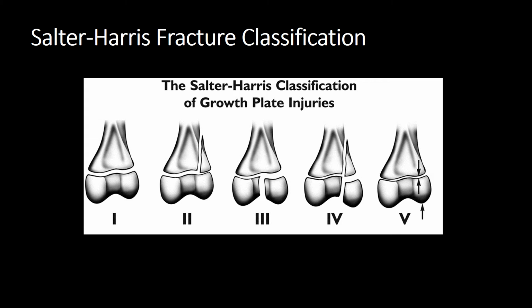So in long bones or miniature long bones, the tubular portion of the long bone or miniature long bone is referred to as the diaphysis. Once it starts to flare out, this area here is referred to as the metaphysis. The physis separates the metaphysis from the epiphysis, and the epiphysis is sited at each end of the long bone or miniature long bone.